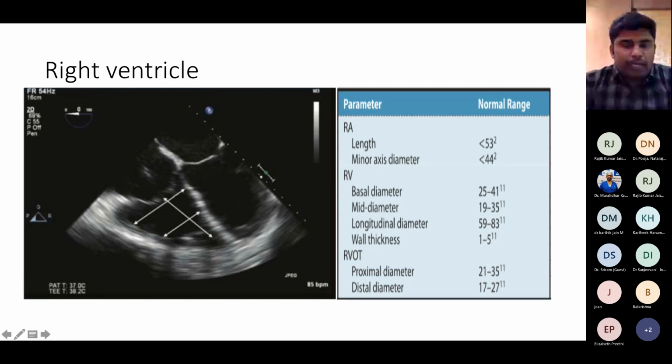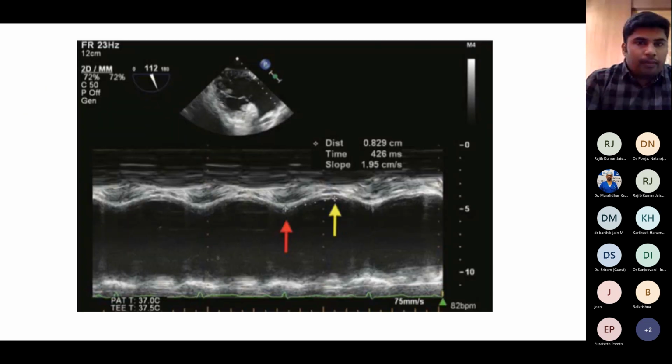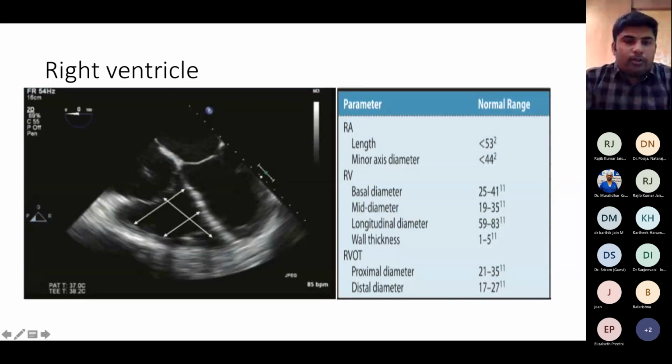The outflow tract diameter, RVOT, can be measured in the RV inflow-outflow view. Since in a single 2D echo we can't see the inflow part and the outflow part simultaneously, it is not possible by the 2D method to measure the volumes of the RV. So 3D methods are always used to quantify. The TomTec software provides an option to measure the RV volume considering both the inflow and the outflow part of the right ventricle. The normal ejection fraction of the right ventricle is more than 45%.